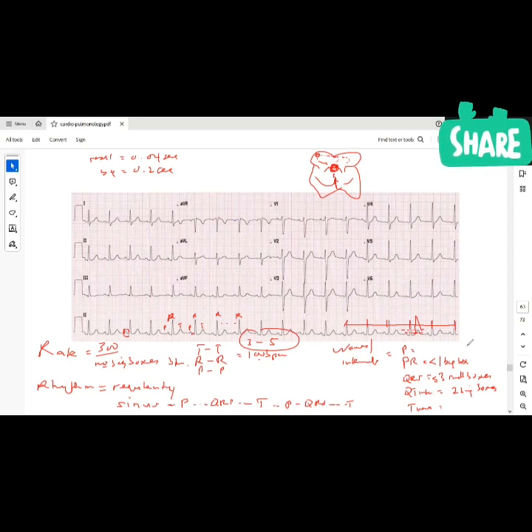And there are, of course, some other nuances when it comes to ECG. Some special things, like you can look for evidence of hypertrophy. How do I know if the ventricles are undergoing hypertrophy? You're looking at the height of, remember the V's, especially V1, V5, and V6, right? They are looking at the left ventricle, the anterolateral wall of the left ventricle. So if the left ventricle is thicker, I might see what? A very, very deep S wave in V1, deeper than usual, or a very, very tall R wave in V5, V6. Super tall, and then V1 will be very, very deep.